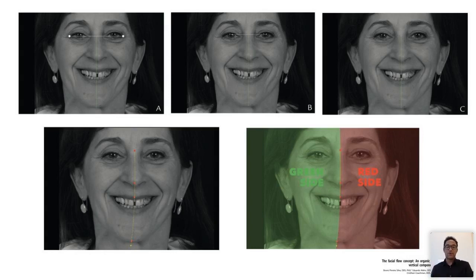On letter B, we have another concept where it shows that we have to draw this line from the interpupillary line and then draw a line right in the middle of it. And what do we get from there? This is the base of dentistry, and it is extremely important, but it's extremely mathematical as well.